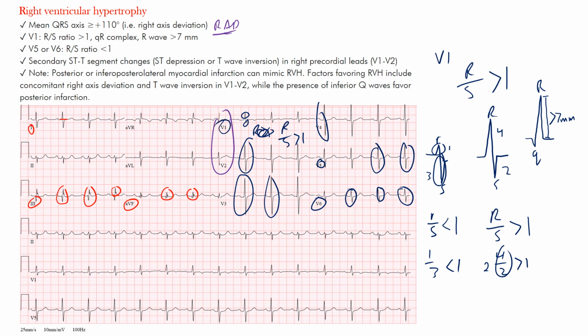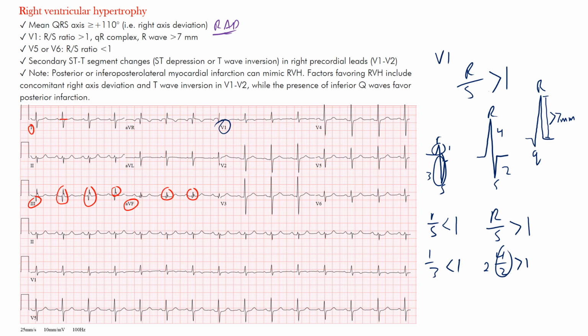Okay, so it really is clinical context. It's not simply just the EKG. You have to always keep clinical context in mind. Why is the patient presenting, and so forth. Okay, the other thing you have to note is that there can sometimes be secondary ST segment changes.